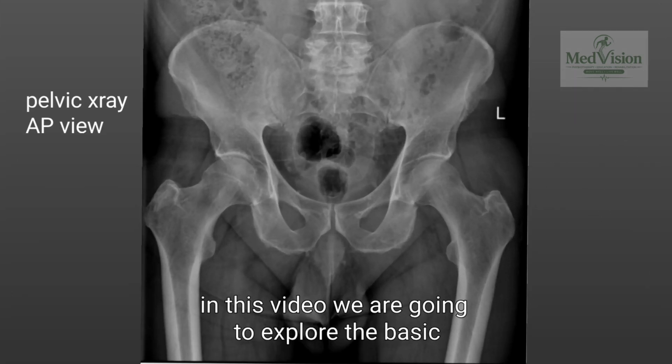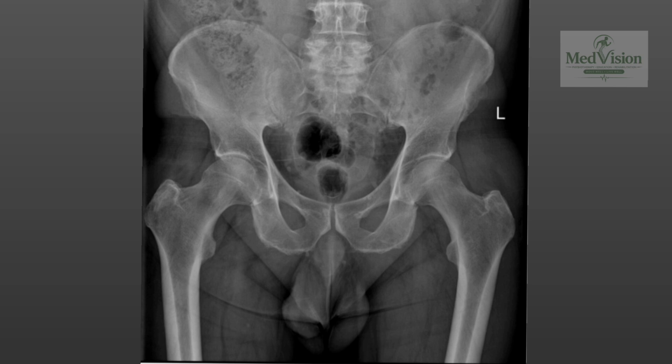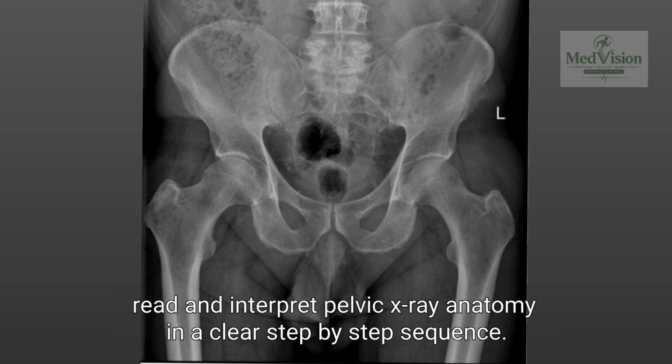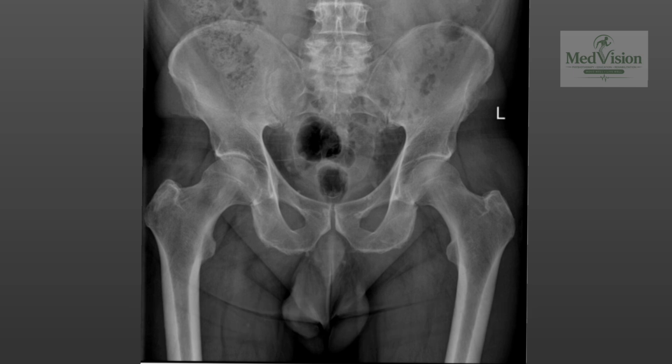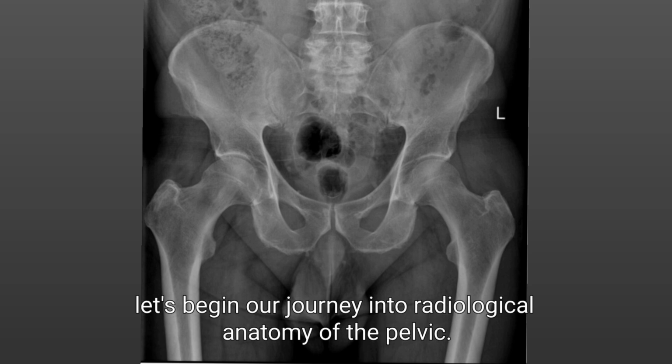In this video, we are going to explore the basic anatomy of a pelvic X-ray in a systematic and professional way. This explanation will help medical students and healthcare professionals learn how to read and interpret pelvic X-ray anatomy in a clear step-by-step sequence. So without further delay, let's begin our journey into the radiological anatomy of the pelvis.